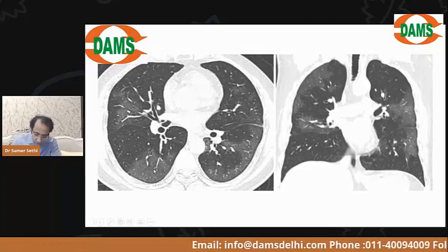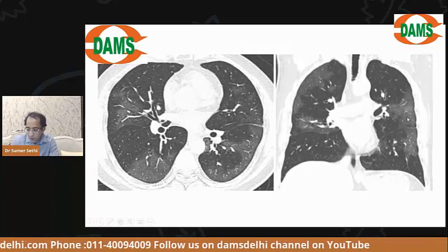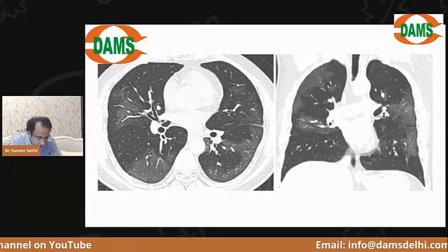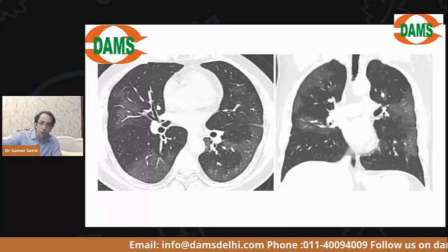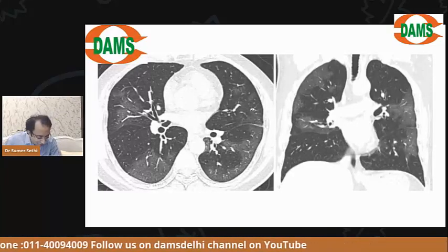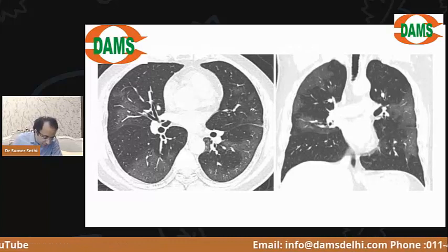I will show you better. So please see with me. So when you see this here, can you see this peripheral ground glass opacities, peripheral ground glass opacities? This is the kind of appearance that you will see in typical COVID-19 pneumonia now. Okay, so this is what we see in a patient. Now the history will not say smoker, long-standing breathing difficulty. No, they will say a man in 2020. Okay, person in 2020. You will think of COVID-19 pneumonia here. Are you clear now? थोड़ा सा समझ आया?